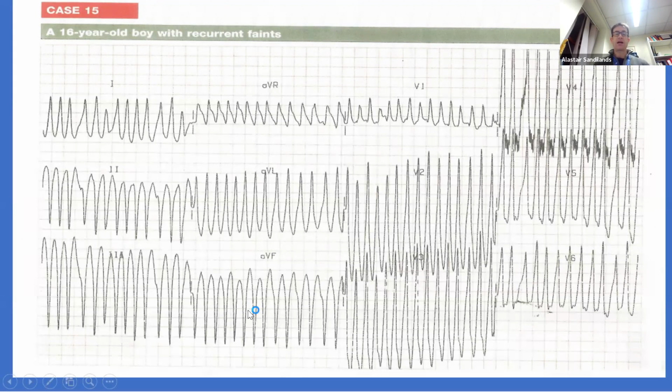Okay, so in this example, I brought it into this area of the discussion, but we have a broad complex tachycardia, but it is irregular now. The spacing becomes different between each QRS. And also the QRS heights are variable, okay? And it's irregular. So do we see a typical bundle branch block pattern in V1? No, we do not. Do we see evidence of a delta wave? Yes. You can see that these have a sort of partial delta wave, but this is full pre-excitation of the delta wave.